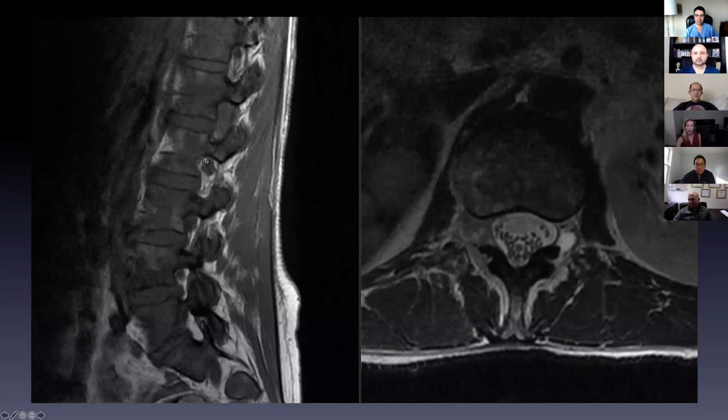This is the fat around the nerve root. And this is how we look for nerve root compression. The less fat there is, the more compressed the nerve is in the foramen. So coming down, looking at nerve root fat, you can see here at this level, big gray blob. Obviously that is not a normal foramen, not a normal nerve root. This was the only place in her entire spine that actually had epidural extension of disease.